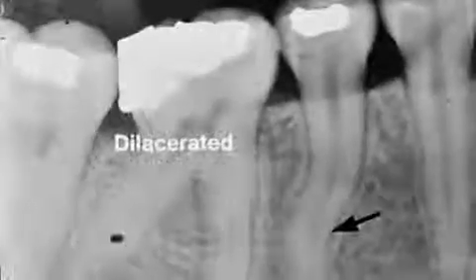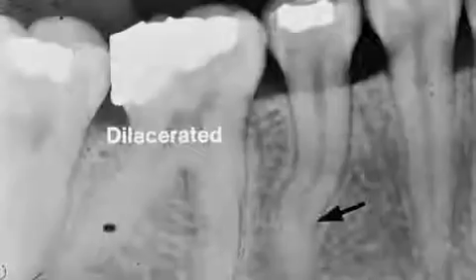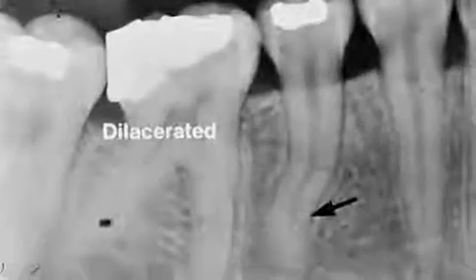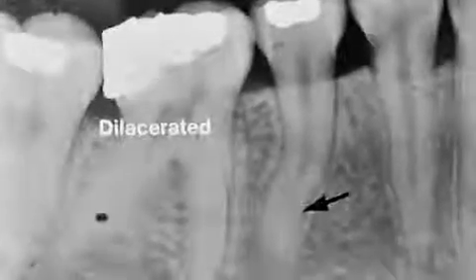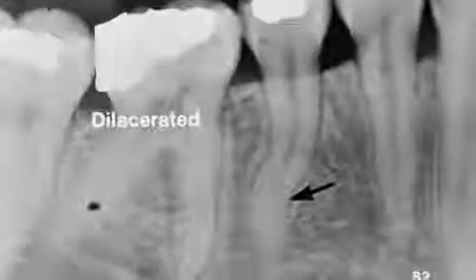The arrow points to tooth number 28. The tooth has a crooked root. We call this curve of the root dilaceration. It occurs during morphodifferentiation in tooth development.